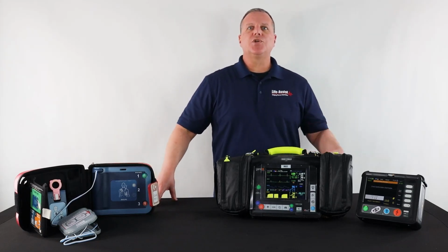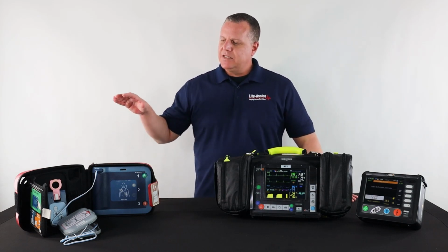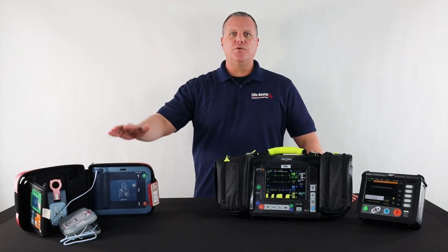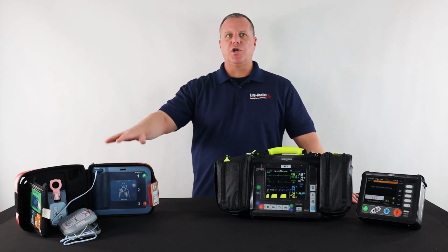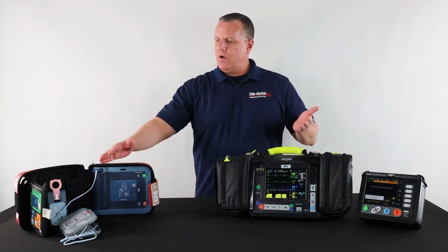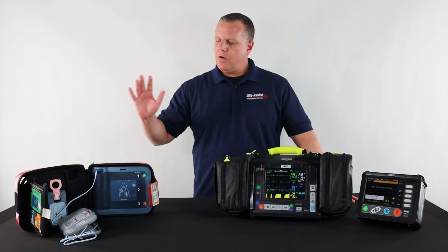One thing about the AED to note is that it does not monitor vital signs, so it's not monitoring blood pressure or pulse rate, or SpO2 or end-tidal CO2 or anything like that. Its sole job is just to shock, okay? You might be wondering, what are the special features besides that? There are some good features.